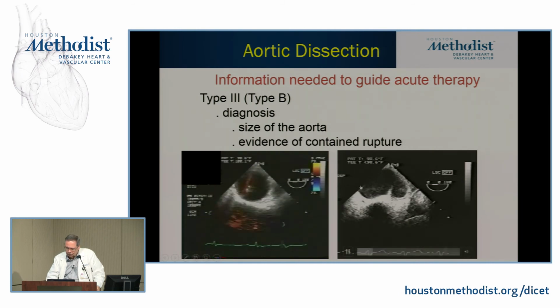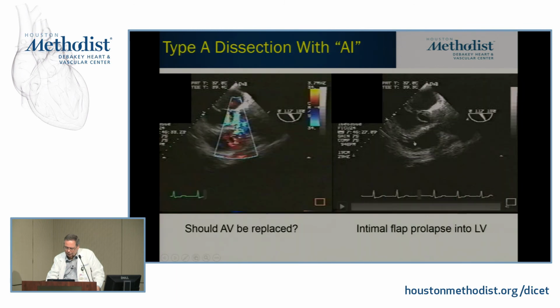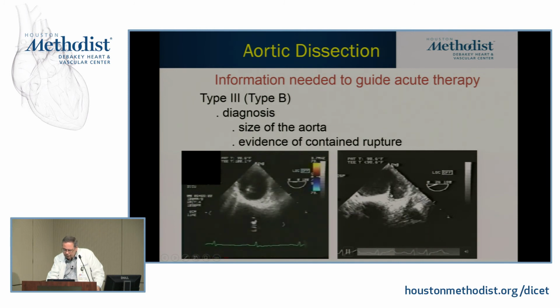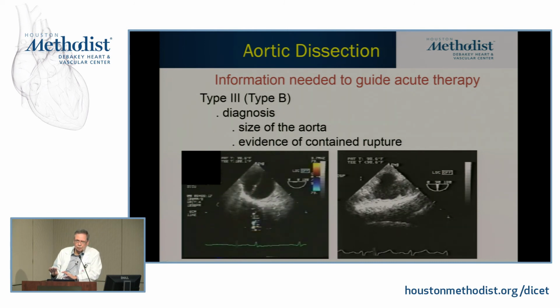Okay. So here is the dissection. This is the false lumen, and now you have this. Okay? I'm going to show it one more time because it's very cool. And also very important that you recognize. So this is the flap there, false lumen, then there's a break, and you have this here. So this is the fear of dissections, right?